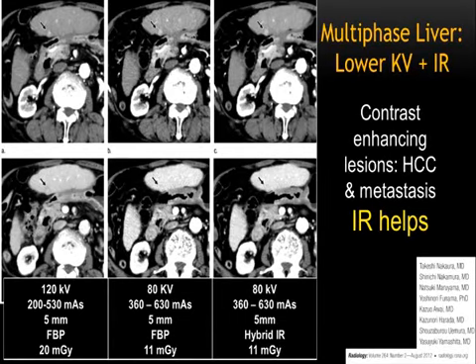So just dropping the kV, you can actually tolerate much more noise because the iodine stands out much brighter. So you do not really need to essentially have iterative reconstruction. It obviously does help, but it's not crucial. Right? And if you are planning to add the iterative reconstruction technique to low kV, this paper actually tells me that they overshot the radiation dose. They didn't really get the full worth of their money by applying the same dose with filtered back as compared to iterative reconstruction technique, and they could have gone even lower. And that's when the role of iterative reconstruction becomes even more important.